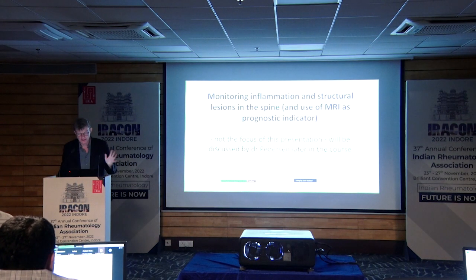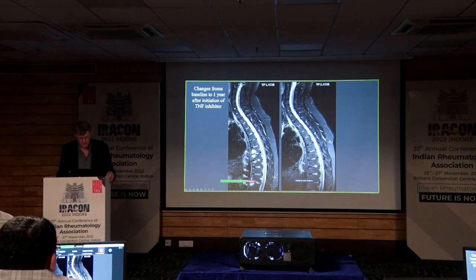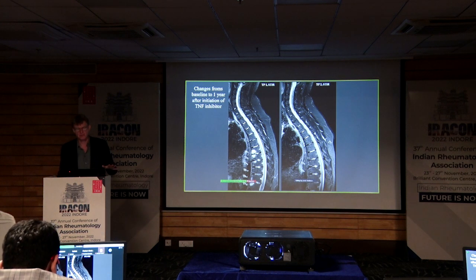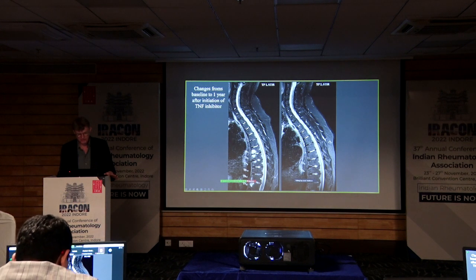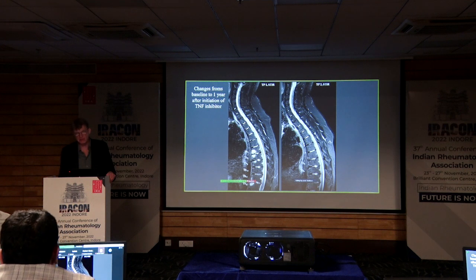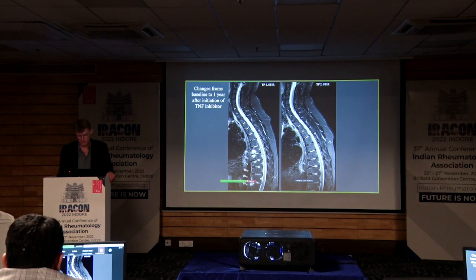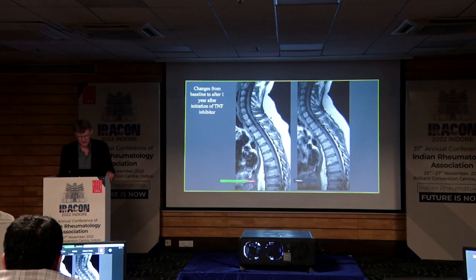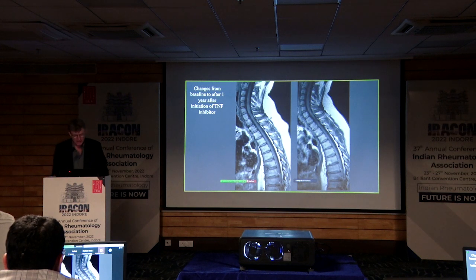So then one slide I will just show you, because the interesting thing is that you can monitor inflammation by MRI. You can see here a case with a lot of inflammation in different locations, and then after treatment it's gone away with any treatment. That happens, and sometimes it stays there, and then I would say the drug doesn't work. So that's an option. It's not our focus today. So this is actually the last slide I'll show you before we take a part of the quiz, at least before we end.